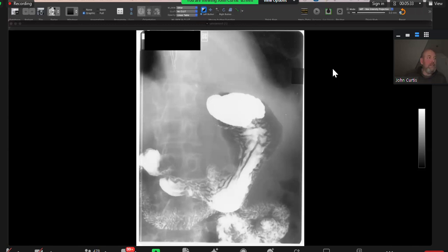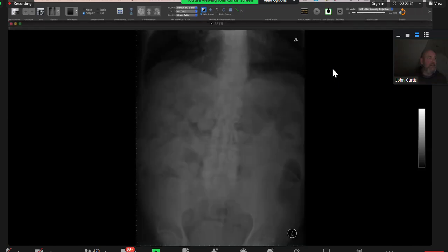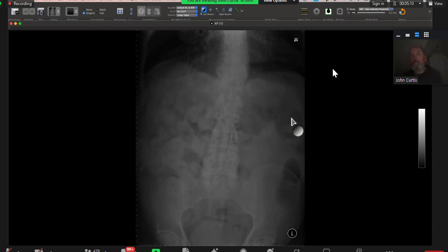Excellent. Excellent. Next case. Okay, so this patient's got abdominal pain. I'm provided with the radiograph of the abdomen of a skeletally mature patient, in which I can appreciate that there are multiple rounded opacities noted in the right hypochondrium, as well as in the lumbar region. Just point those out.